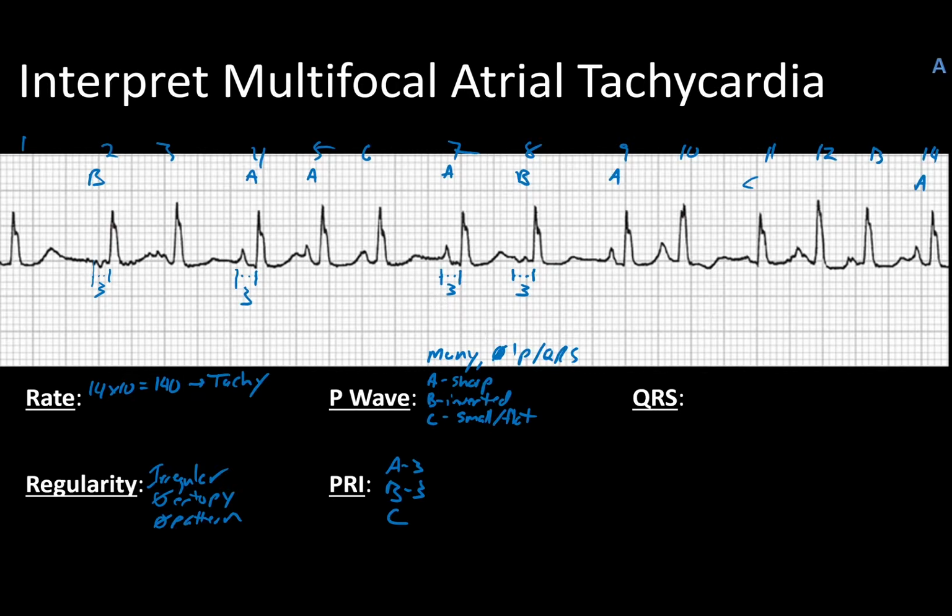We only have one to go off of, but let's measure C. It starts probably around there, and that has three as well. This is actually a trifecta. It's kind of unique to have all three be identical, but they're obviously extremely different, so it's hard to say that that's not correct.